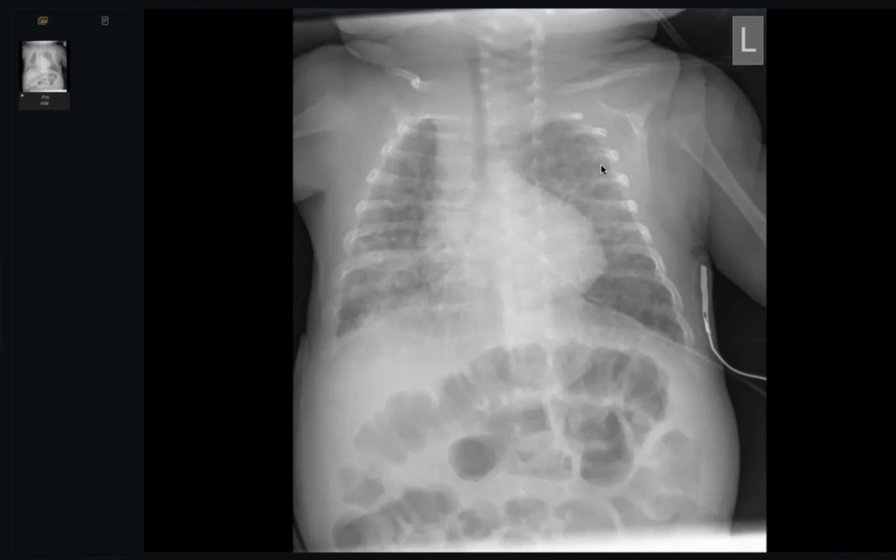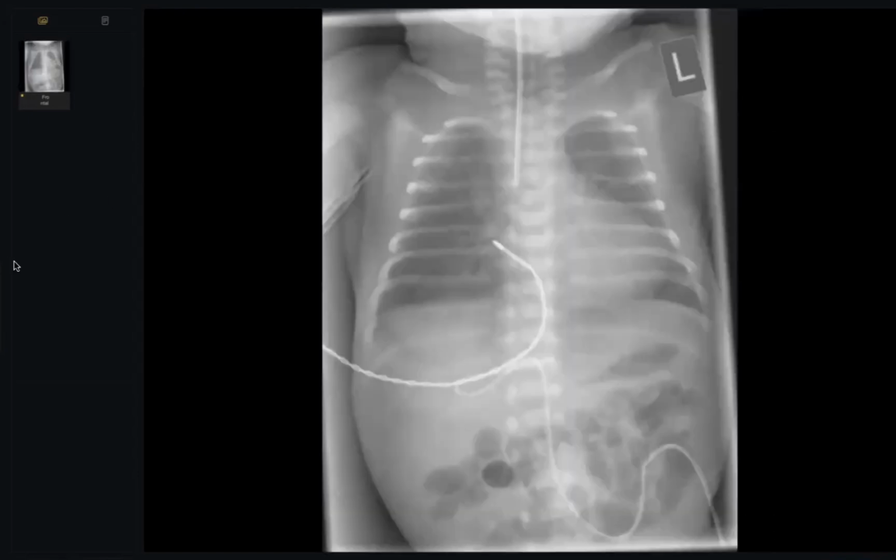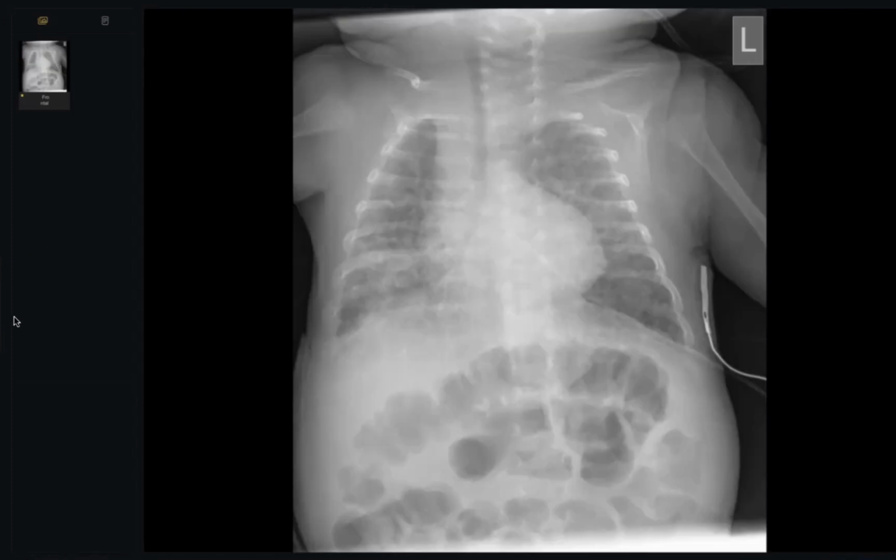It is, I think, retrolental something. I forgot the name. Retinopathy of prematurity. Very easy, yes. Okay, thank you, doctor, so much. The case started with some malpositions and RDS, and then bronchopulmonary dysplasia. The volume is reduced.